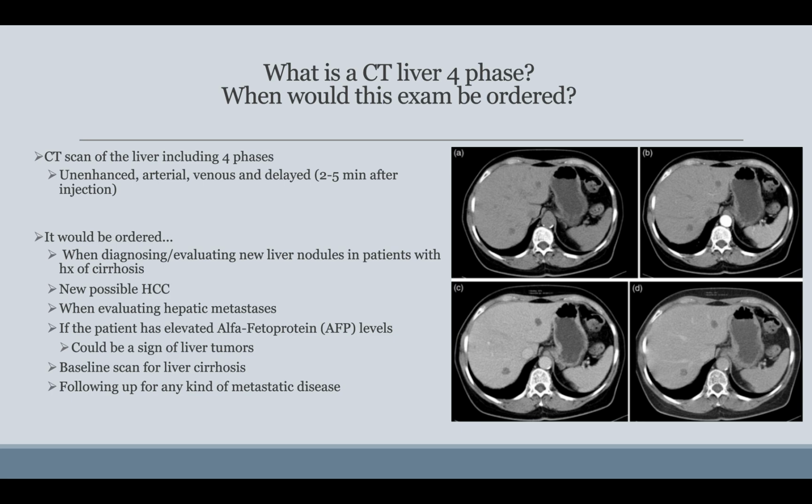Some clinical indications when this exam would be ordered is if the physician is diagnosing or evaluating new liver nodules in patients with a history of liver cirrhosis, if there's a new possible hepatocellular carcinoma, which is what HCC stands for, or when evaluating hepatic metastases.